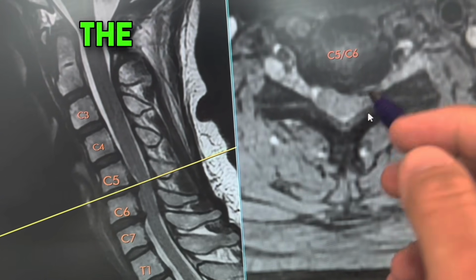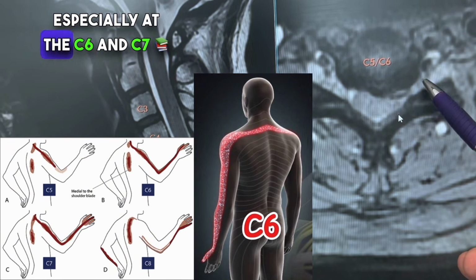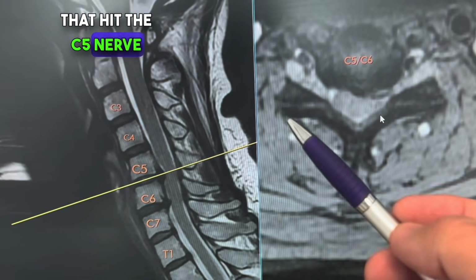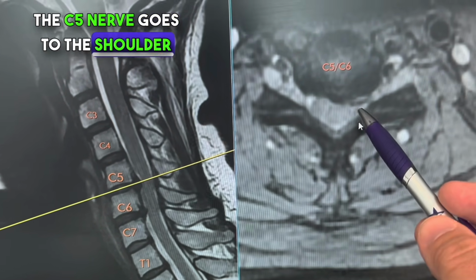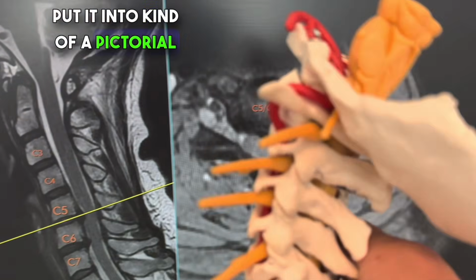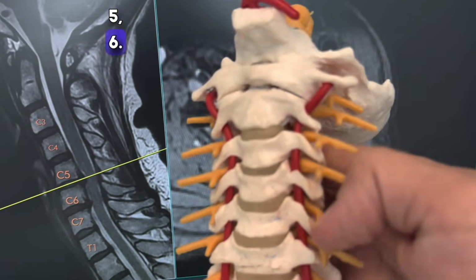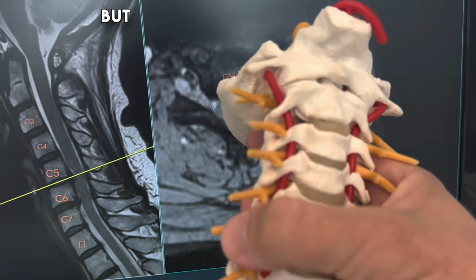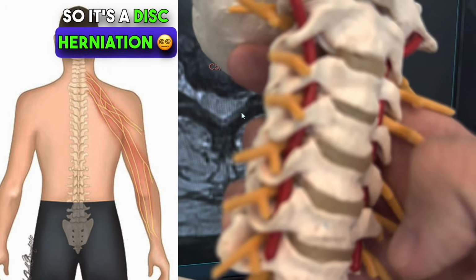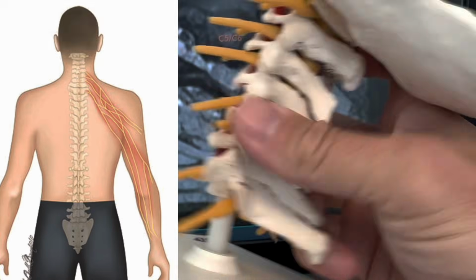That kind of goes down the arm, usually to these two digits here, but there's a lot of overlap, especially with C6 and C7. If it was C4, C5, that hit the C5 nerve. The C5 nerve goes to the shoulder. So right here is the C6 nerve, and to put it into a pictorial representation, you're C2, 3, 4, 5, 6, that'd be this nerve, but this nerve right here on the other side is what's getting pinched. So it's a disc herniation coming out, hitting this nerve right here.